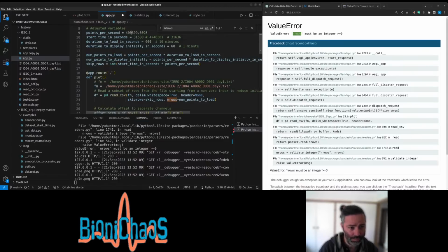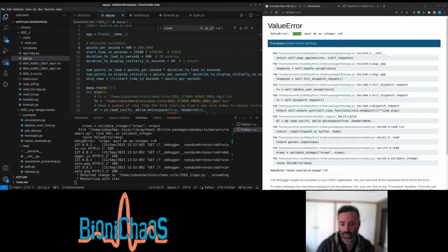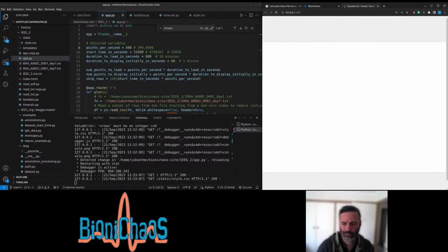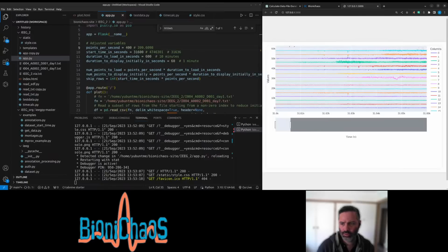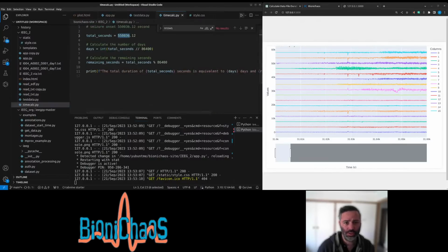Okay, let's just keep it 400. Make a comment that there's a more precise version of it. We calculate time calculation.